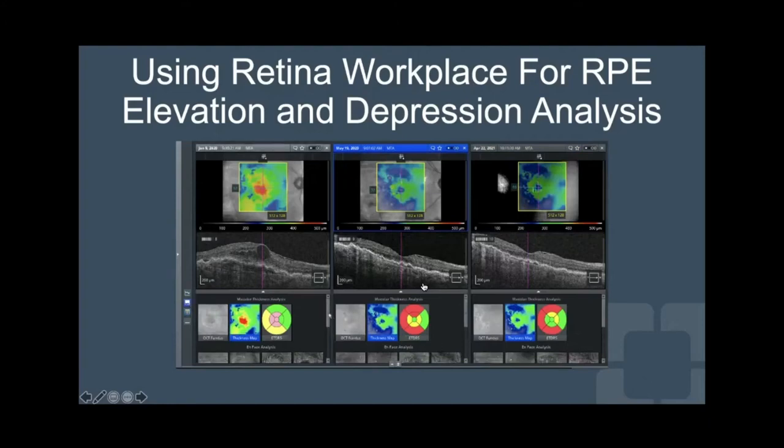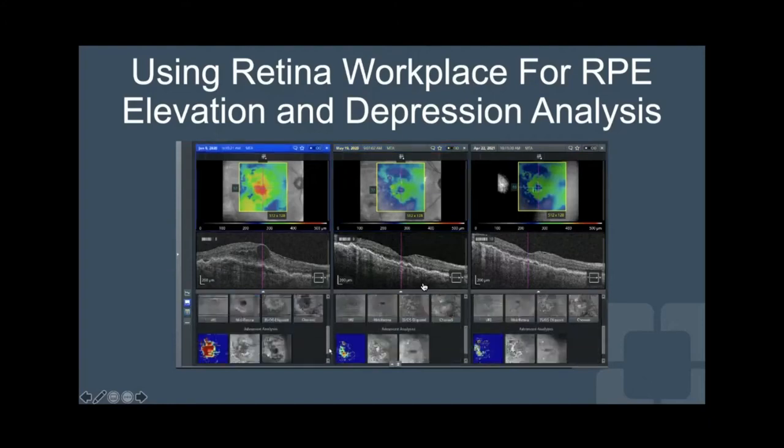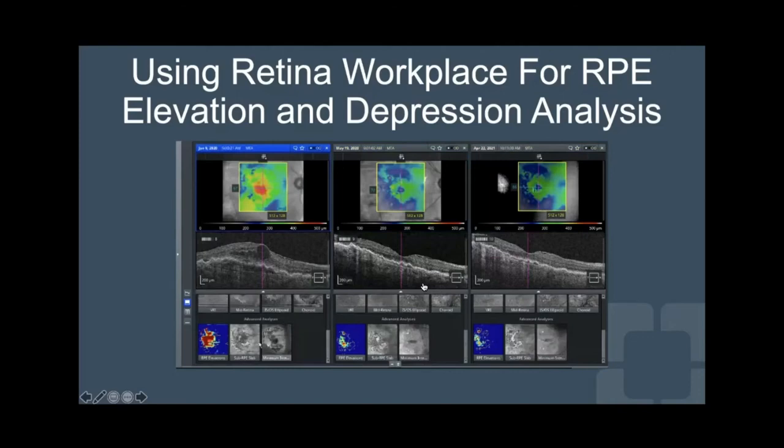And then I can also look at the en face analysis through the software as well, looking at the RPE elevation on the far left and in the middle and the far right, where I can see truly there's been a treatment response in this patient over time.